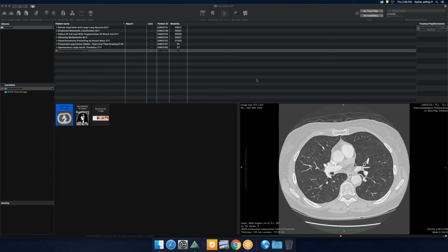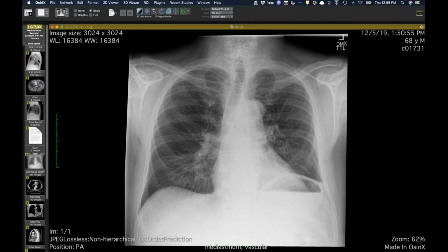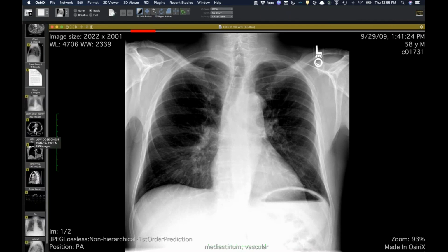I want your thoughts on what you guys think, and I don't think it's fibrosing mediastinitis, but the point that Howard brought up, or the finding on the radiograph of your case, is kind of interesting. I saw this radiograph earlier this month, and you can see there's this extra contour adjacent to the aortic arch. And I went back, and first I'll show you the radiograph. So this is 10 years ago, and it's been there. In the acute setting, you think maybe there could be a dissection or displaced intimal calcification or lymph node or something there, but the fact that it's been there for 10 years plus, certainly not.